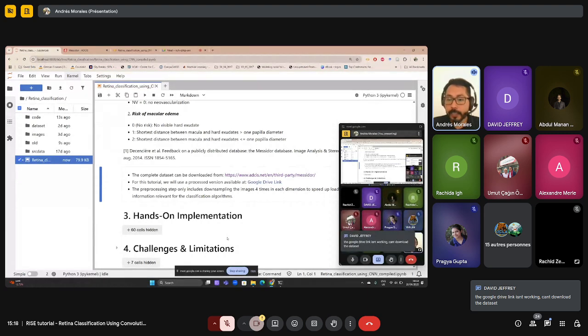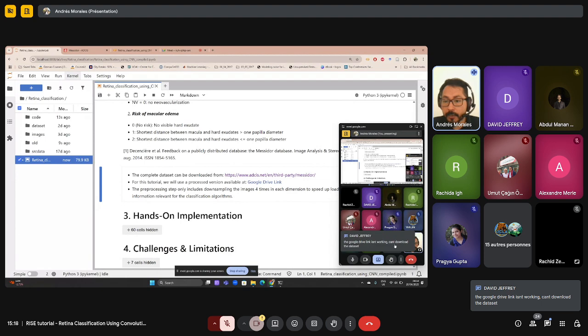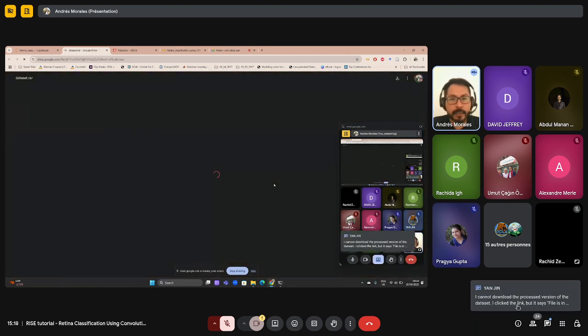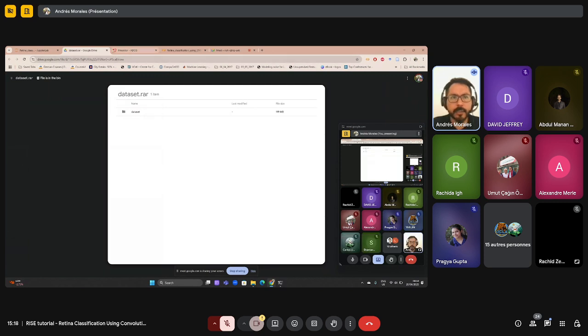And then you can download it from the Google Drive dataset. You can see it here. Anyway, in the notebook, if this is not working, if you have problems, I will check. It should be fine here, as you can see. I will have a look.